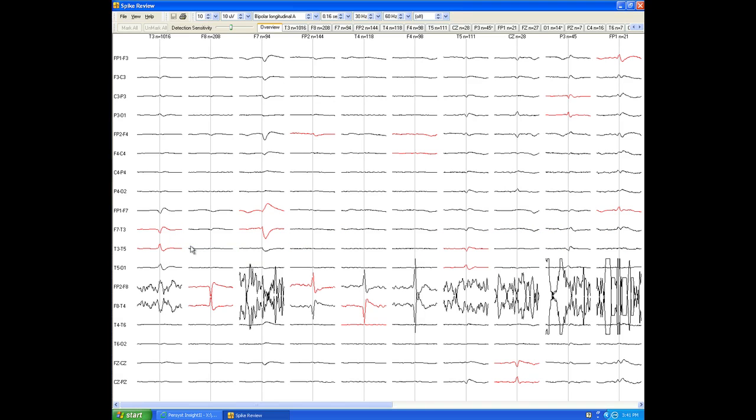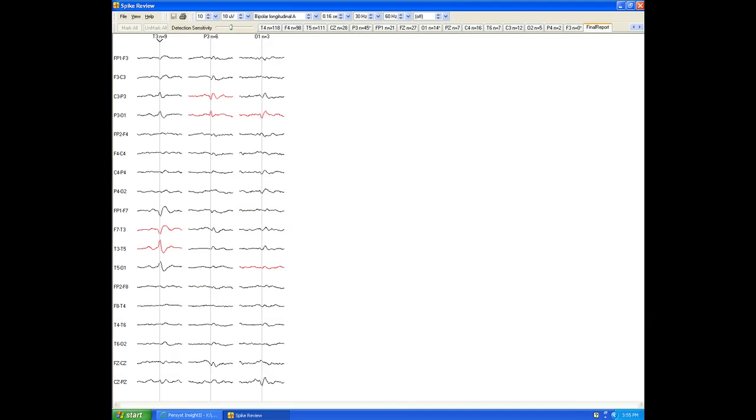And let's move to our final report. From the top of the screen, arrow over until you see the Final Report tab if necessary. Here we see grand averages of the spike events that we selected from the other tabs. We can add a voltage plot to our report as well.